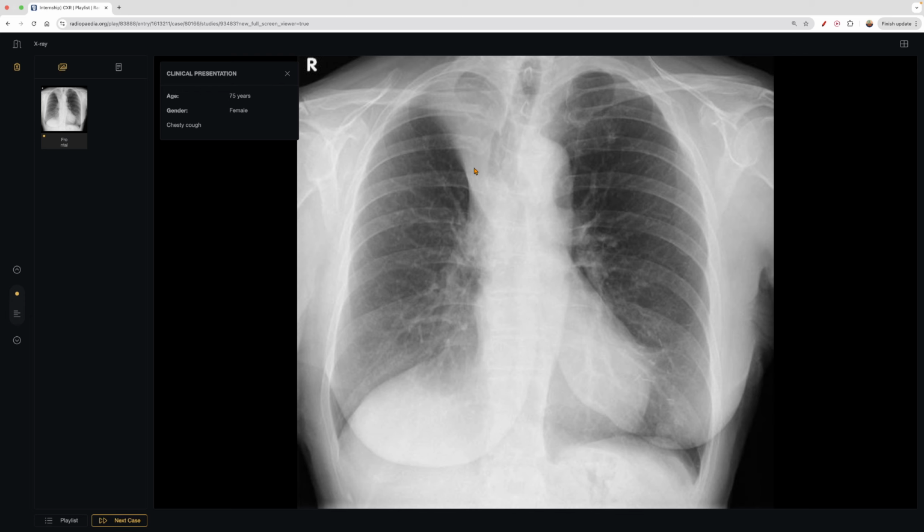Because if we go to our last aspect of the ICAN mnemonic, it's the nodules or masses. And this could be a mass that would be on a differential, potentially, at least, but unlikely. Given this distribution and the way it looks wedge-shaped, right, that's how the lung collapses. And you can see here the trachea is actually skewed to this side, right? Because the lung's collapsing on itself. It's that pressure causing it to come in.